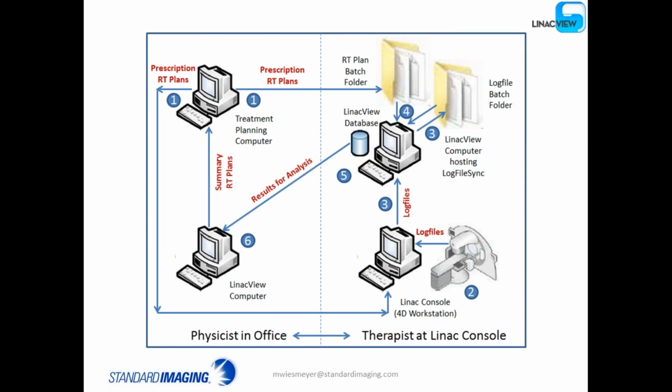So we have an RT plan batch folder and a log file batch folder, and as log files come in, the system automatically matches log files to RT plans and does an analysis. So that's basically how things work. This is one possible topology. You can have a therapist at a console watching the treatments, and I'll show you how that works in the demo coming up shortly.